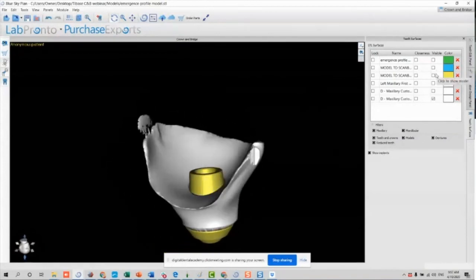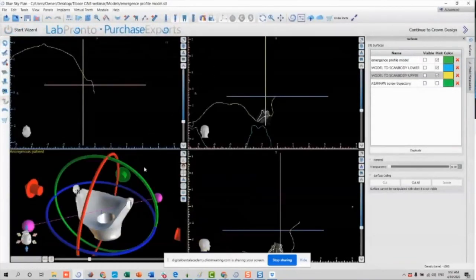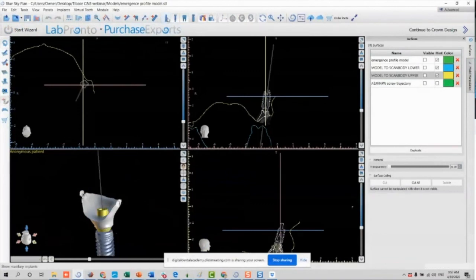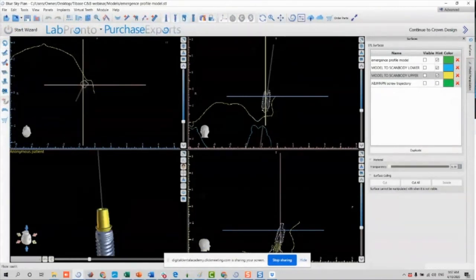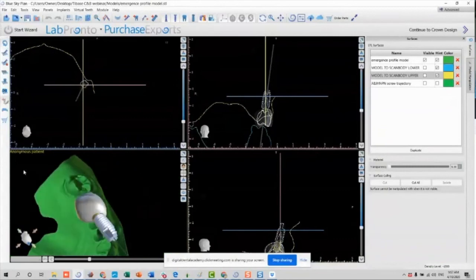Then the beauty of this is, let me just go real quick to the surgical guide module. The beauty of this is that when I let me bring the implant, let me bring the teeth, and let me bring the model. So let's say that I finished creating my tooth.